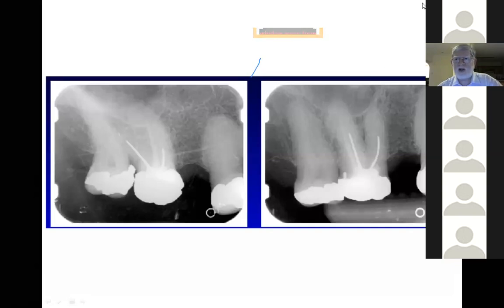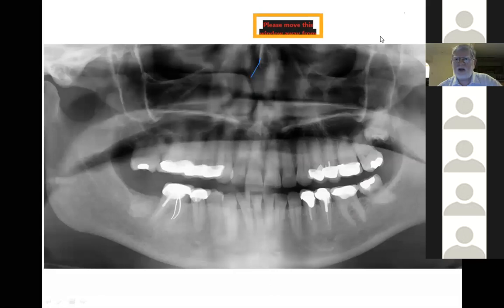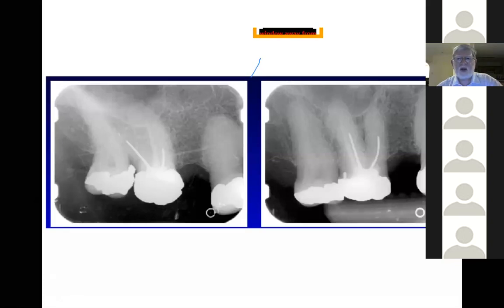Any periapical pathology, sorry? We've just got one answer so far, yeah, osteosclerosis and hypercementosis of the 1-4. Okay, right, fine. And what we've got is the interesting feature here. Yeah, we've got the hypercementosis of the 4, fantastic.